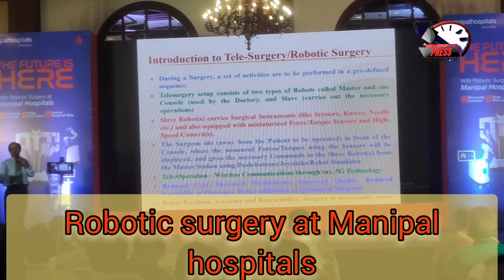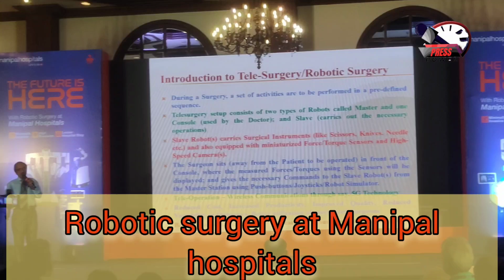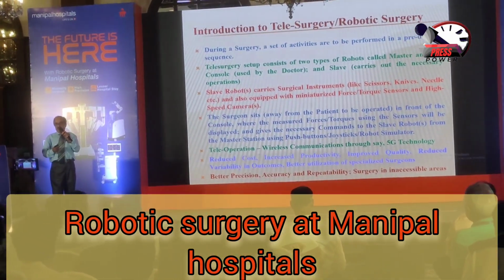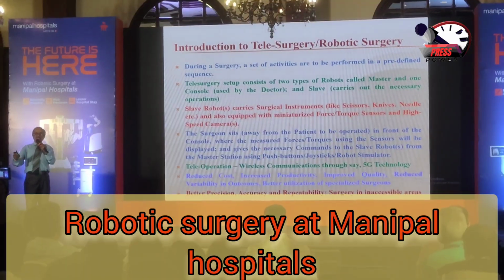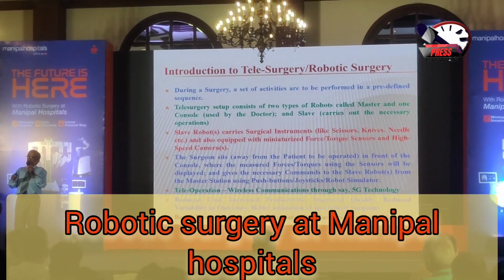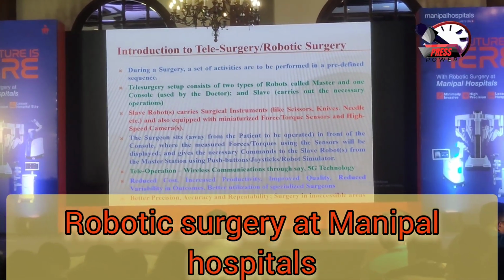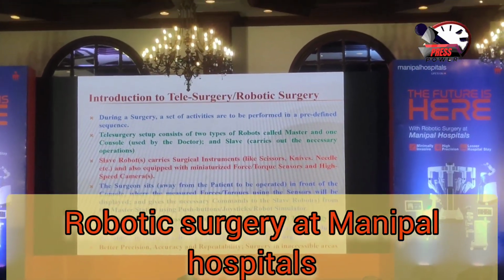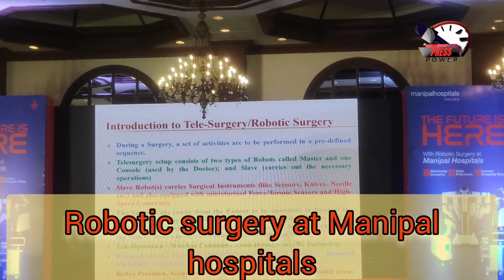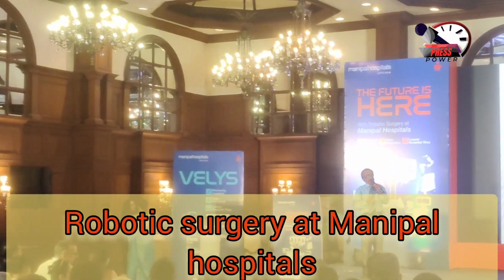And this particular slave robot is equipped with some sort of force sensor, some sort of torque sensor, so that it can measure how much torque, how much force is required. For example, if the slave robot is going to use the knife, this robot will have to put some force. If it is going to use scissors, there must be some torque requirement. So those things are to be provided.